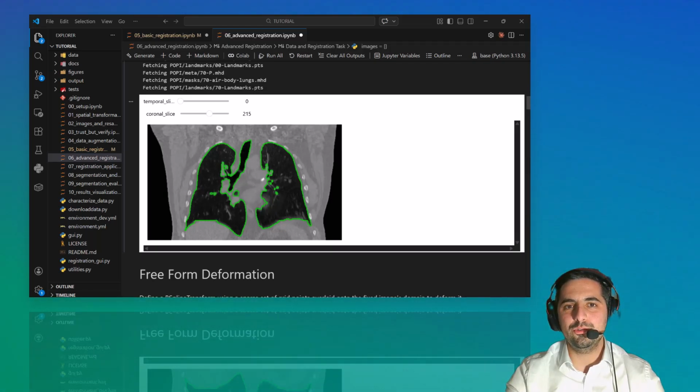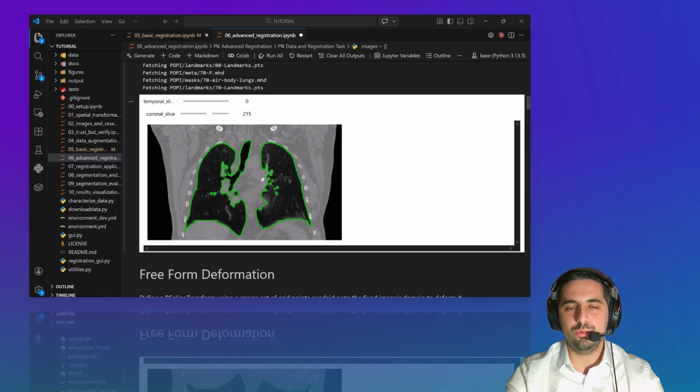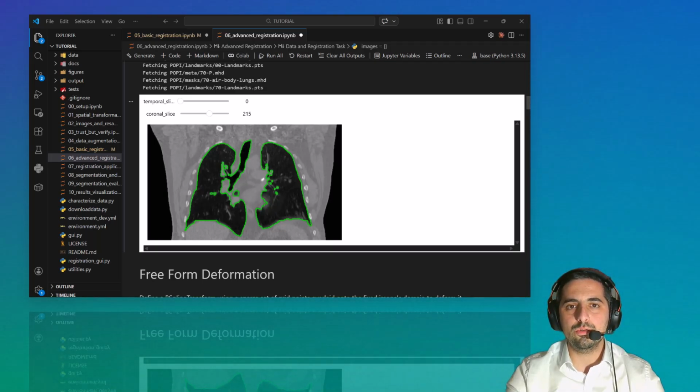Today I want to follow the respiration cycle of a lung with you. How do we do that? We need to do a non-rigid registration between the landmarks of the lung from the initial respiration cycle timestamp to the final one, or to another one. For that, we're going to use SimpleITK with the ITKv4 framework for the non-rigid registration, which is using the BSpline. The BSpline method is like the basic curves method.